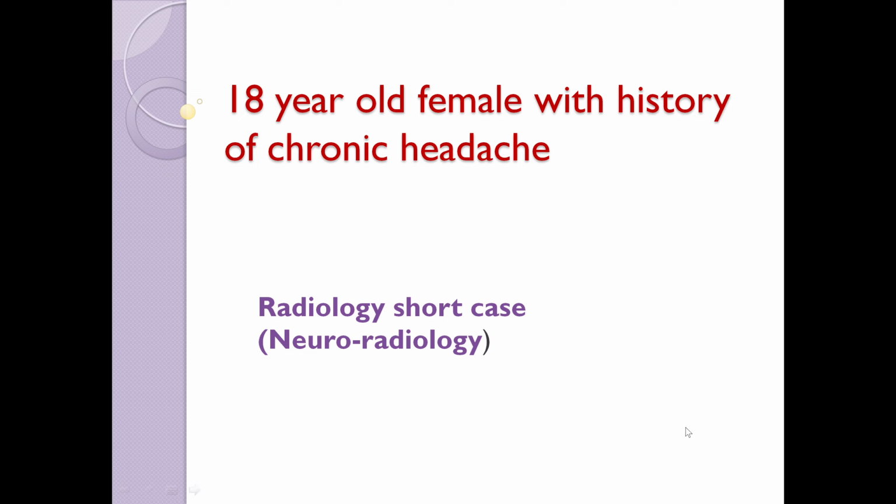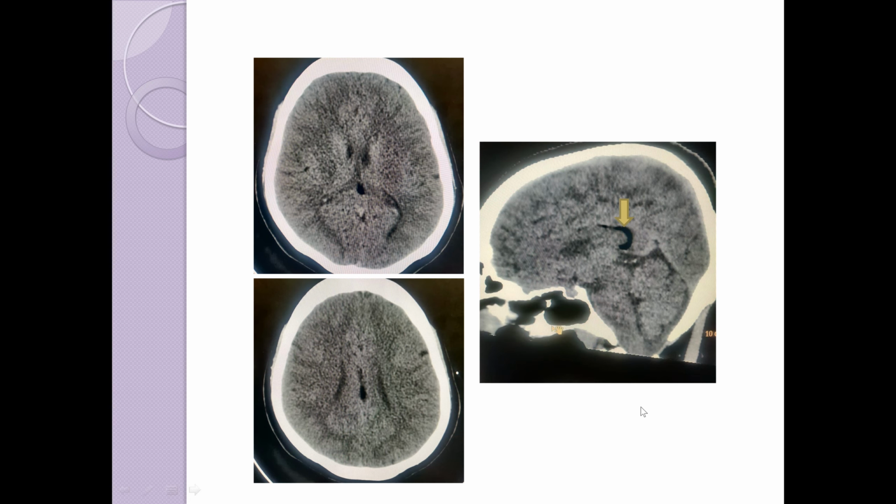Today we have an 18-year-old female with history of chronic headache from past few years. These are the NCCT scan of the brain at the level of lateral ventricles.